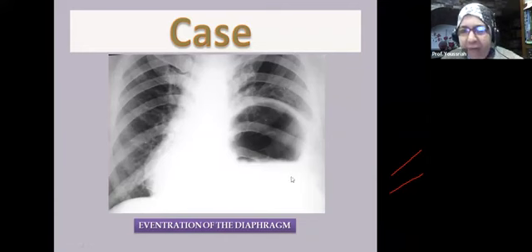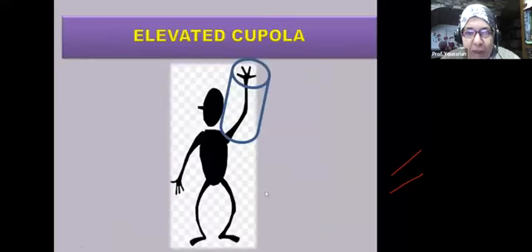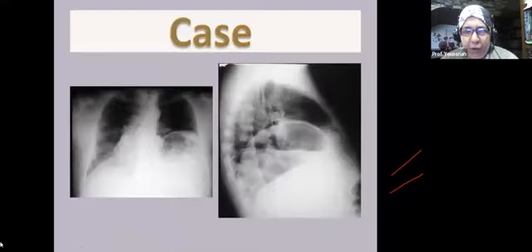Nowadays, you may have many other opinions coming in. They may say eventration may be congenital, may be acquired. It can be due to paralysis, can be due to trauma. This is how you can be misled. You will not diagnose anything. Now let us consider this appearance, with an elevated left cupula with contralateral shift in an erect person, to equal a congenital elevation, which is eventration.